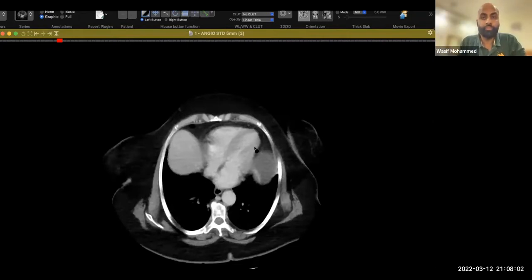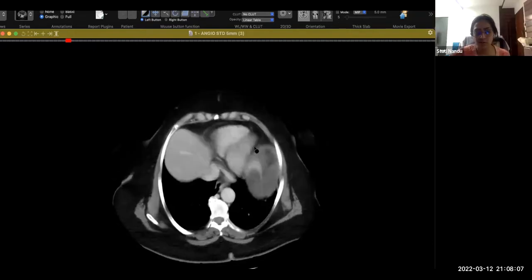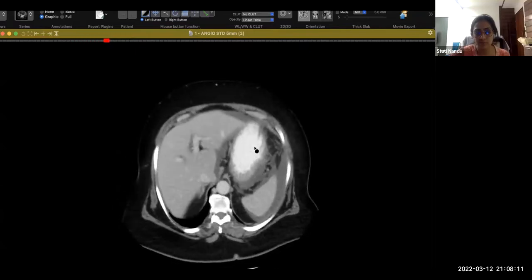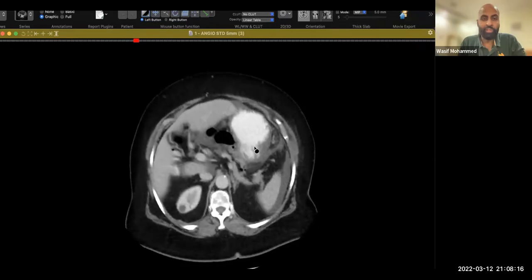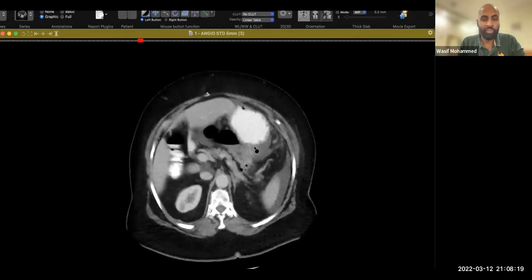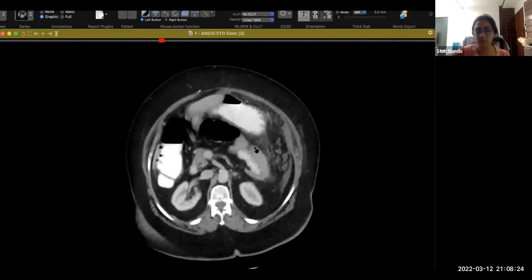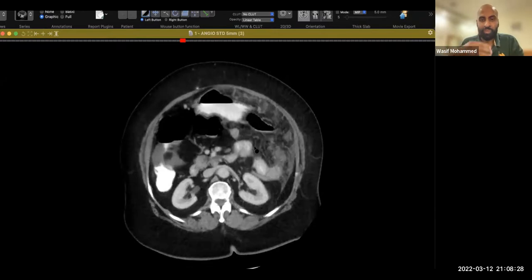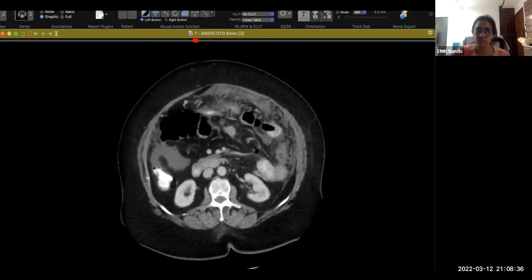Okay. Provided with post-contrast CT images of the abdomen. If you say the introduction within a sentence before even scrolling the images, you'll have an awkward time scrolling the images. You need to prolong that. I'm provided with the post-contrast, or contrast portovenous phase, axial sections, and all those things as you're scrolling, so you don't have that silence.